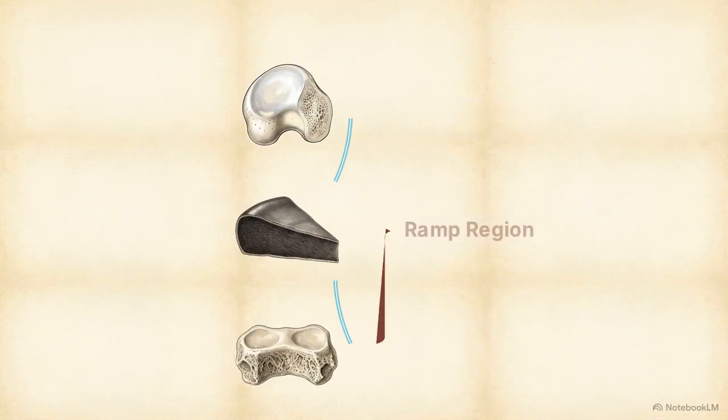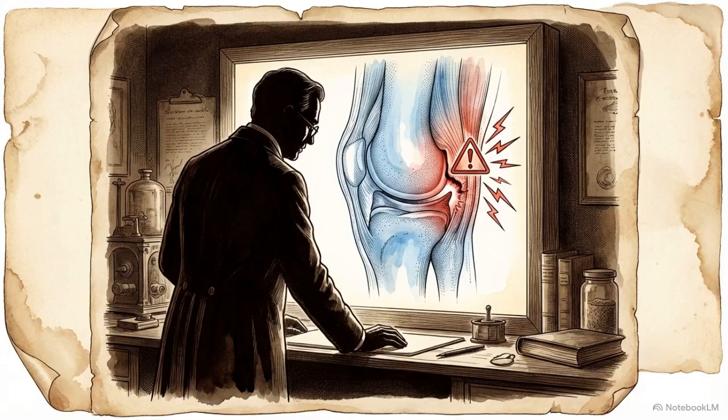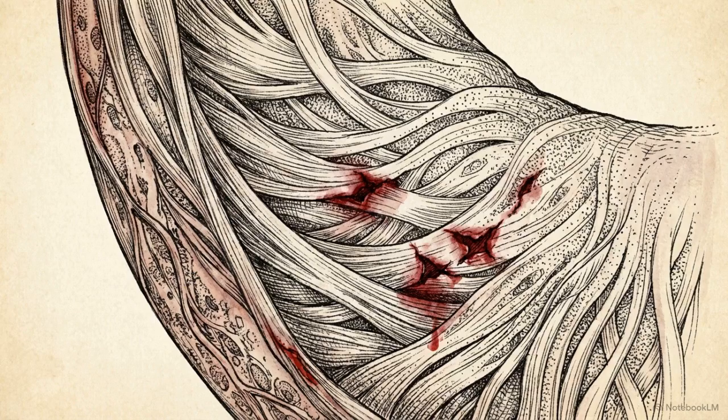The defining boundary for a modern ramp lesion extends inward from these attachments. It encompasses a strict zone reaching exactly 3 millimeters deep from the posterior periphery into the meniscal substance. If radiologists limit their diagnostic search only to complete capsular detachments, they will reliably miss tears localized within the attachments themselves or within that 3 millimeter peripheral zone.